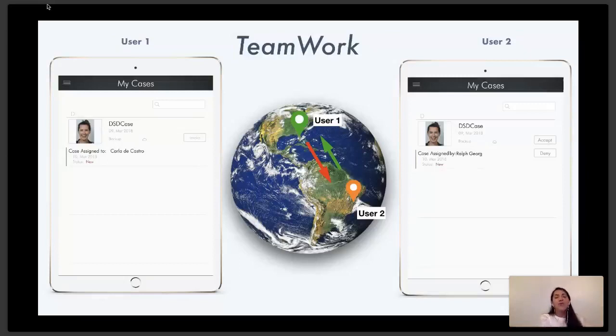The lab is going to be able to open the case, make some changes, add something, subtract anything, whatever you want, and then the lab can send it back to you through the app. They're able to actually manage the case and open it and work with it in the app. Not like the other way: if you send it through email, you're just sending a PDF file of that case.